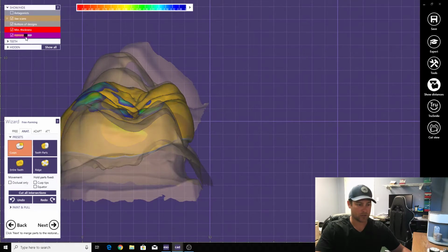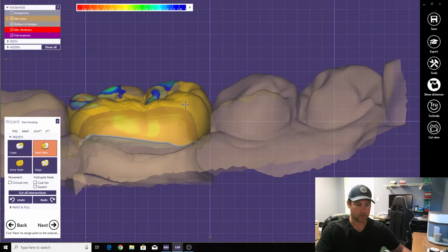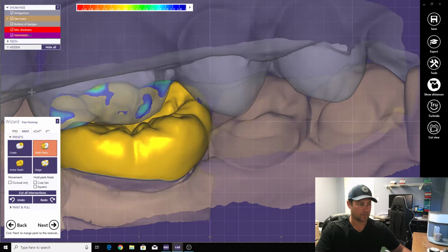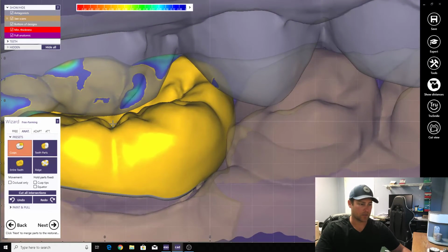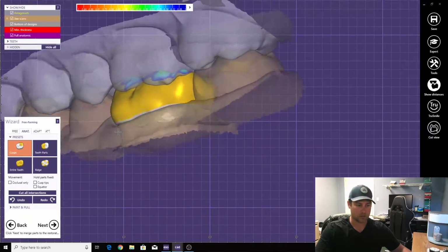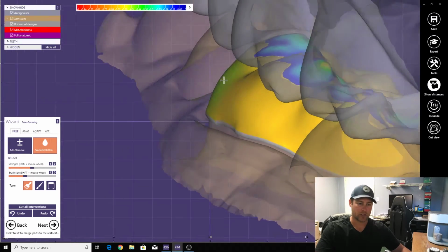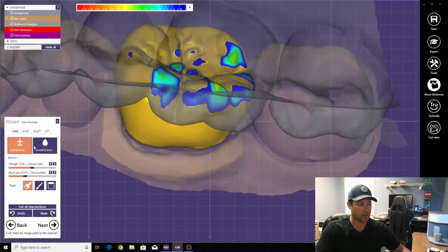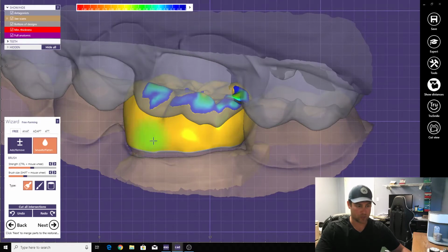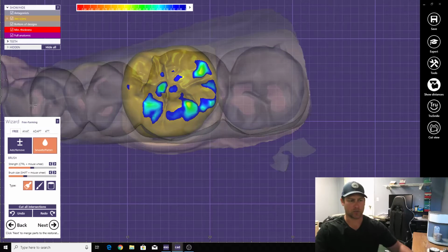Okay. Always check to make sure you're not over. This is too tall right here. I'm holding down the shift key here and using the smooth tool. It smooths and subtracts and just does everything way better that way than the actual subtract tool. I almost never use it.